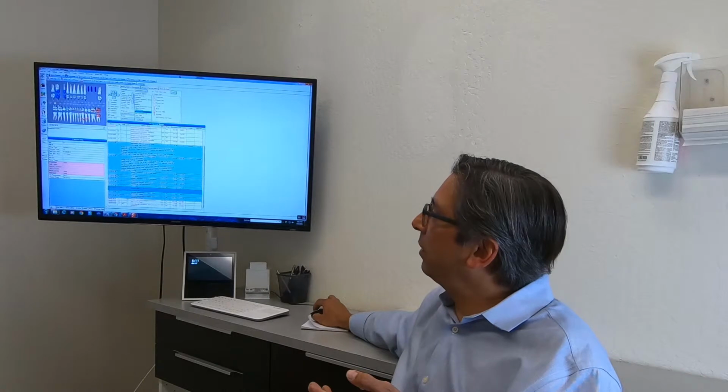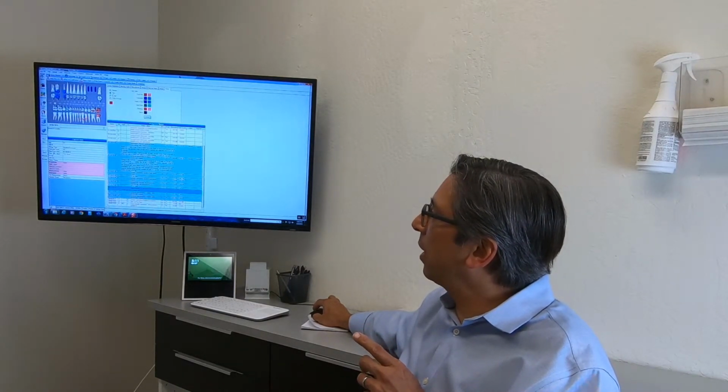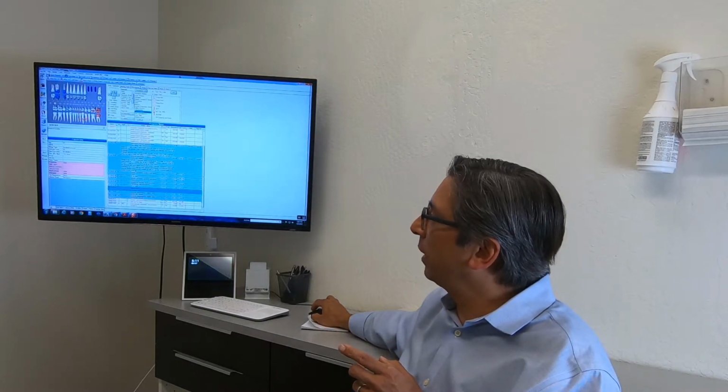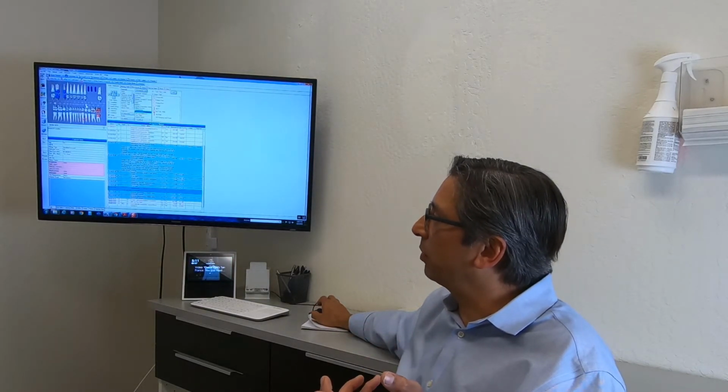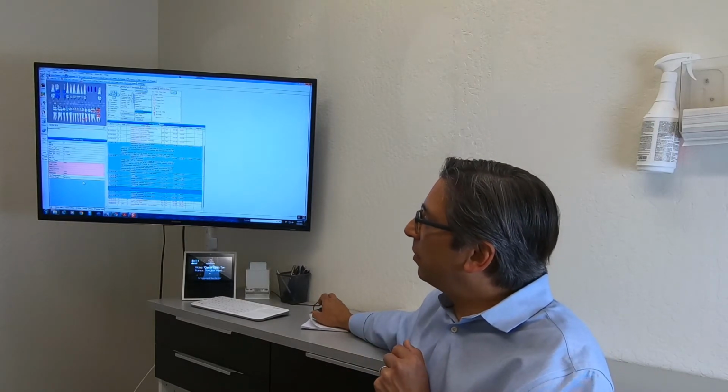But to get out of that, I still have the pen here. So you actually got to click that off and go back to pointer, which allows you to go back to here and actually click on your tooth. Otherwise, you're going to be stuck with the pen and that kind of thing. So we're going to leave that. So that's how that looks.